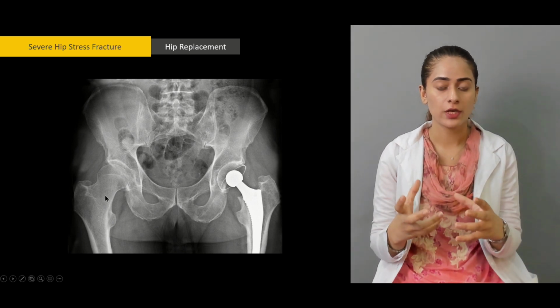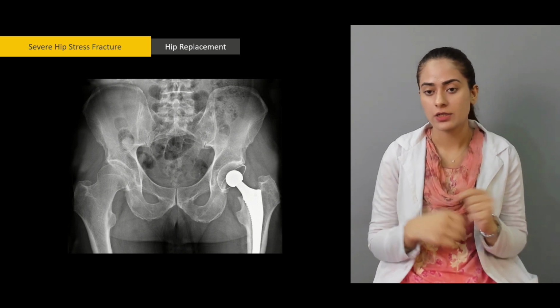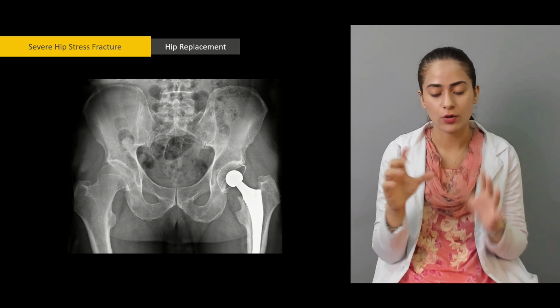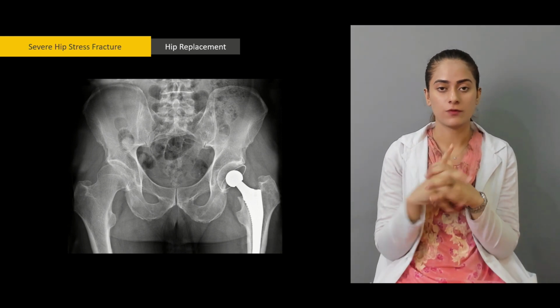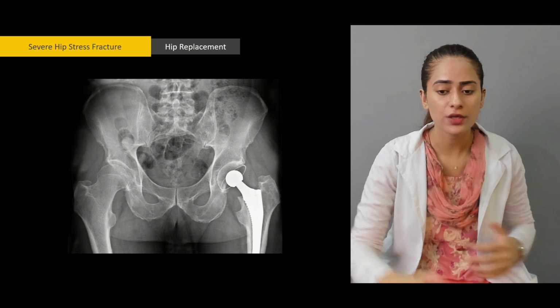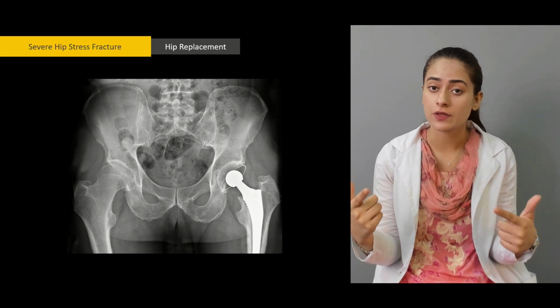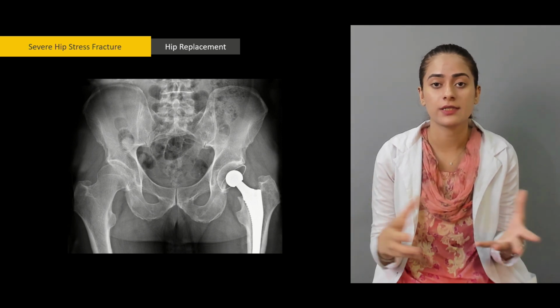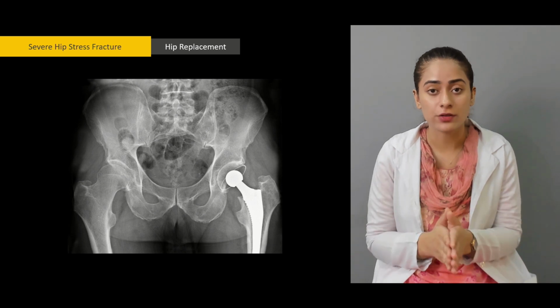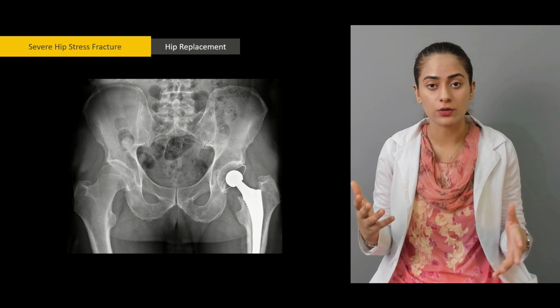Sclerosis will be visible, and then you're going to have to ask for an MRI to actually diagnose that or see how wide the space is between the fracture lines. And if a person says that they're going to continue their activity, there's going to be continuous stress, and what will result is that it will never repair, right? The stress fracture won't repair because they can't stop their activity for a very long time.